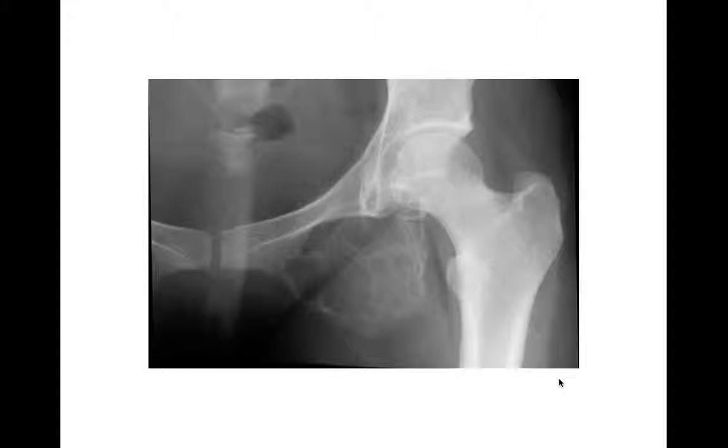Another epiphyseal equivalent location would be, for example, the greater trochanter. It's an apophysis there, so they can actually occur there as well, as can all the other epiphyseal lesions. So for a differential for this, I would consider an aneurysmal bone cyst and a giant cell tumor. Again, a metastasis certainly could look like this from a renal or thyroid primary. They tend to be expansile lytic metastases.